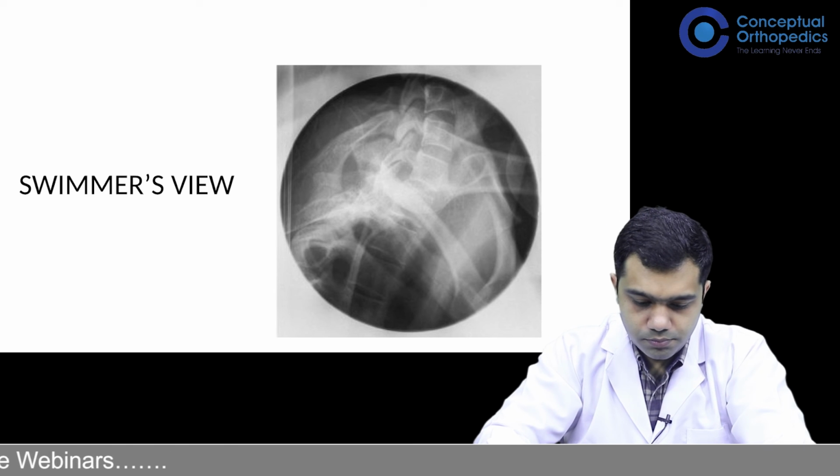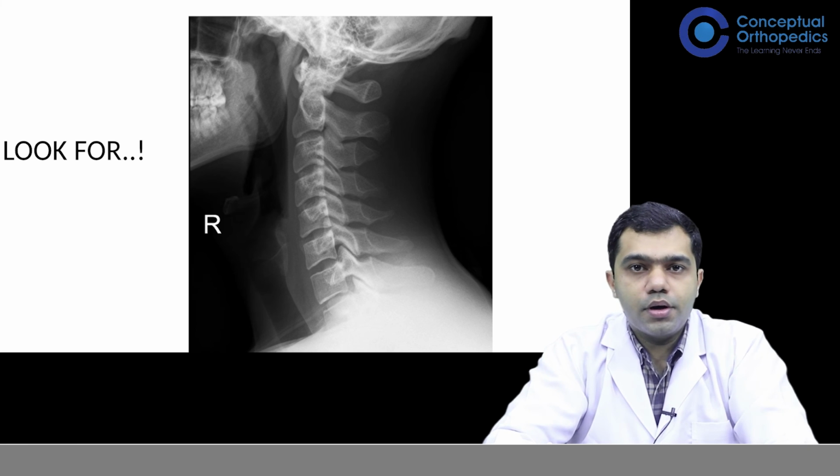swimmer's view. Now what all do you look for in any X-ray?